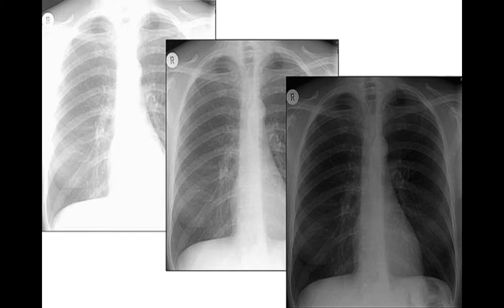And you see, this one appears to be a bit white, and this one, the lung field, appears dark. If it is more white, you can say that there is some lung infection or inflammatory change. Or if you see this one, you can say that the lung field is showing some kind of emphysema.